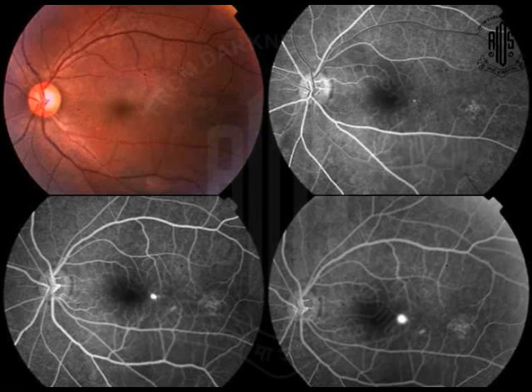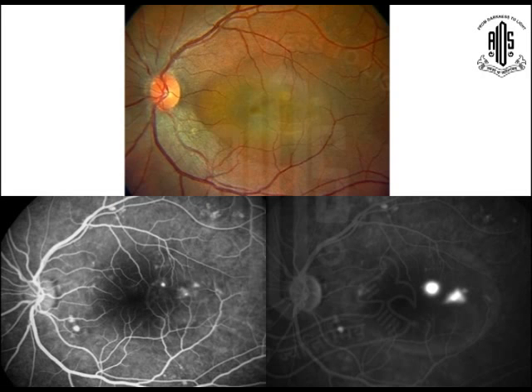We'll limit ourselves to the photos mostly, because otherwise the description will be very boring, I think. So if you see here, there is one small smokestack, ink blot leak. I don't think the pointer is working. So if you see the right hand side upper photograph showing the small ink blot dot point, and the right hand side lower photographs, it's increasing. This is one of the central serous retinopathy with some fibrin, and you can see 2 points are leaking, both are ink blot pattern.